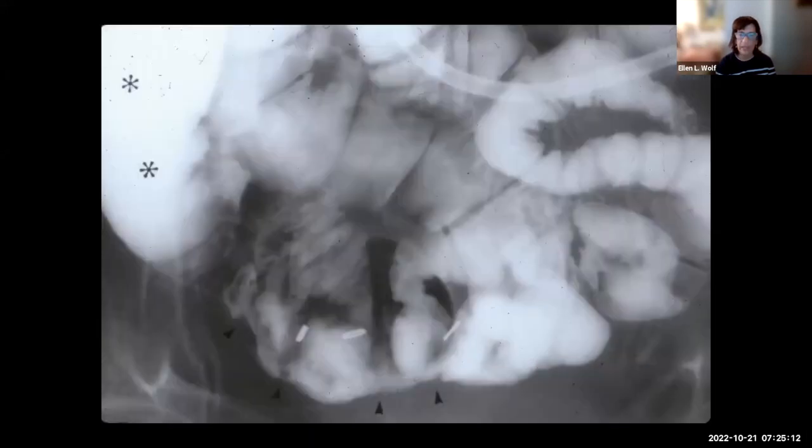This patient went on to have an enteroclysis. We can see that tube here. There's lots of contrast now within the bowel. And we could see that this patient indeed had small bowel obstruction secondary to adhesions, with these straight lines going across the bowel. So this was adhesions, not tumor, not radiation change.